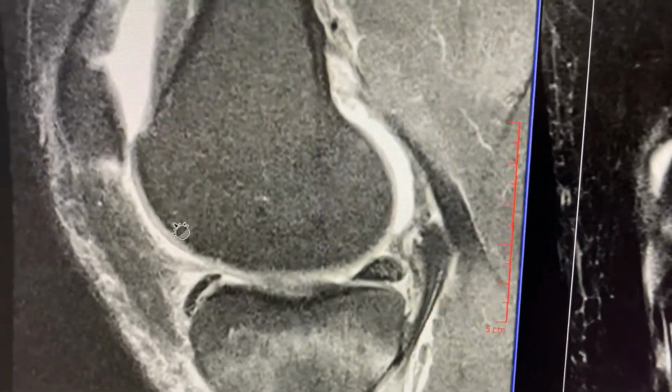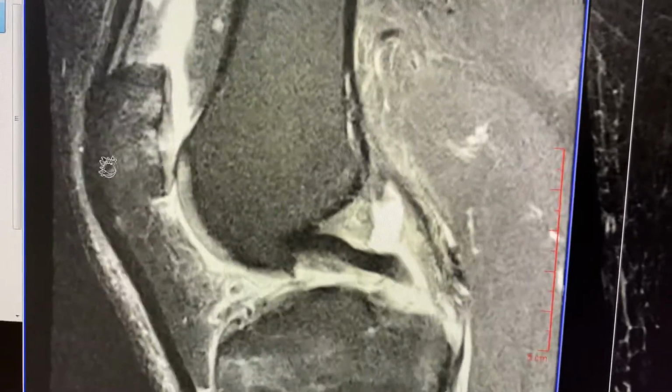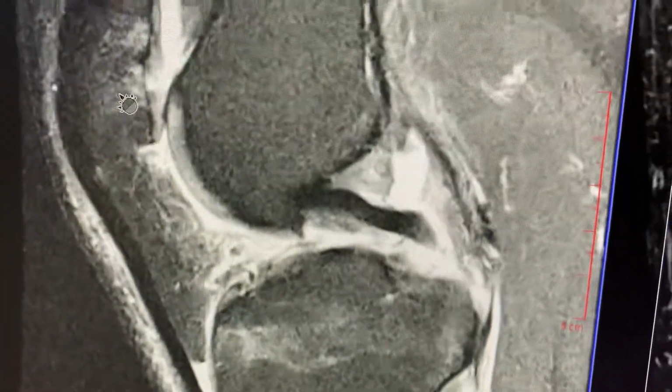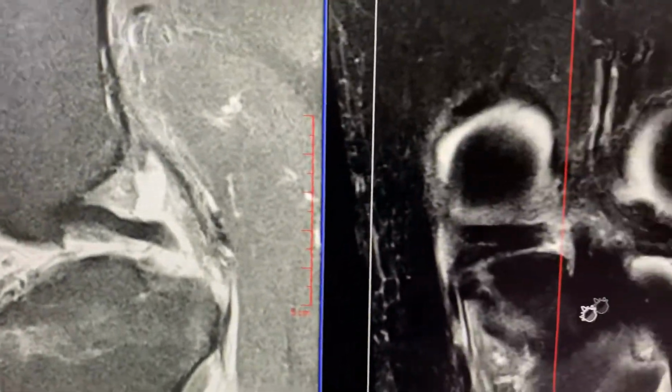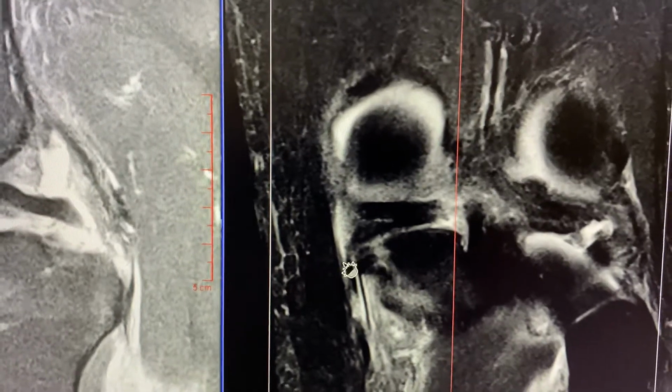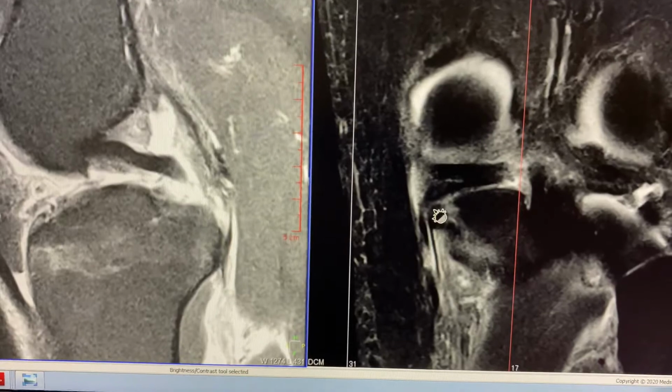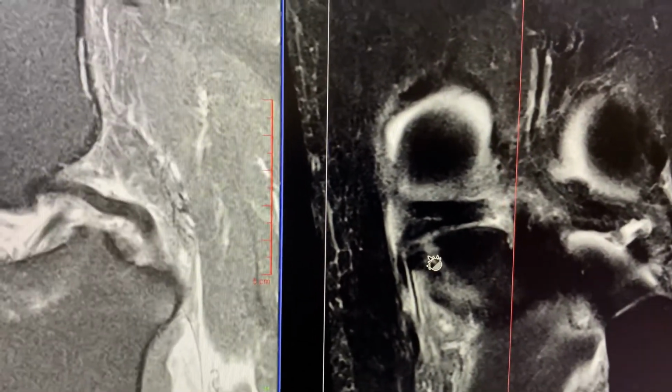Now there are some other pathologies in this MRI. For example, a little subchondral edema over here of the patella, but the patient did not have patellofemoral joint symptoms. Once again, 50-year-old gentleman, misstep, posterior knee pain, swelling, and a weight-bearing related pain that slowly gets better but is not quite right. Root tear of the medial meniscus.